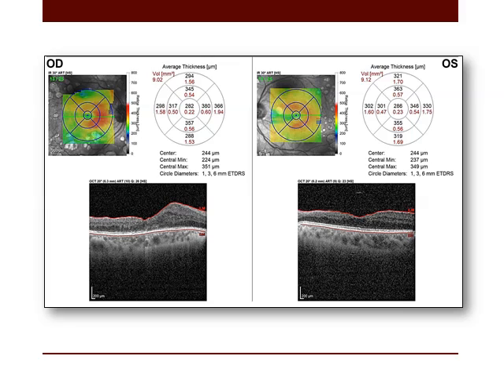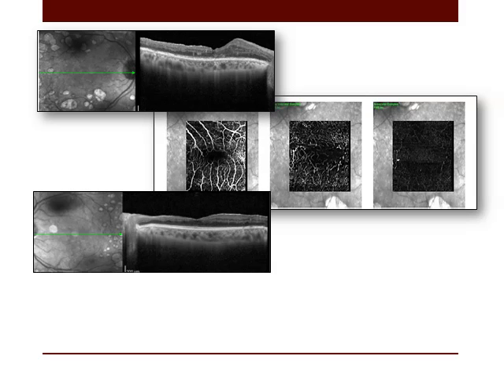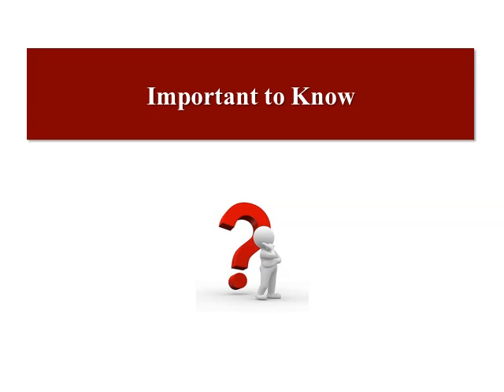What about OCT angiography? Does it have any prognostic factor? Of course. In this patient, we know that this is a patient with papillomacular thinning due to ischemic changes involving the papillomacular bundle. And in this eye, there is central sparing thickening nasal. If we see, the right eye shows evident ischemic changes in the deep capillary plexus, and the left eye shows minimal ischemic changes in the deep capillary plexus, less evident than the right eye. So the right eye shows less favorable prognosis than the left.